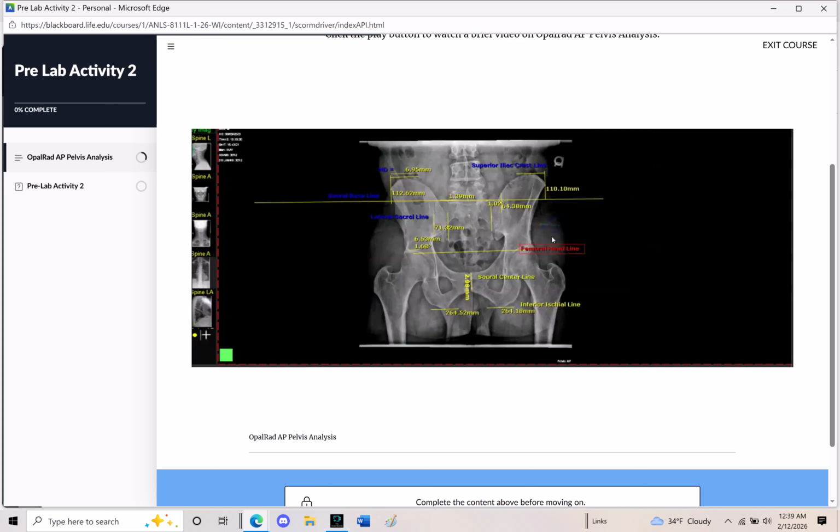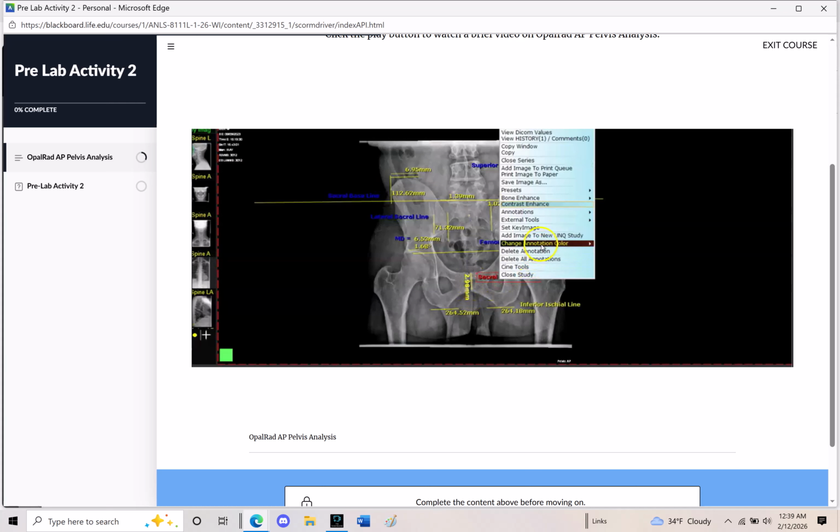But you could change these in any color you want. We're looking for a high contrast though, so I'm just going to pull that over here a little bit more. Nothing's in the way. If the MD was on this side, we could probably do that. Oh, you know what I did? Let's pull that MD down here. We are not looking at this as being MD. That's an additional measurement. We're looking at this one being the MD line. Sacral center line, only line right there.